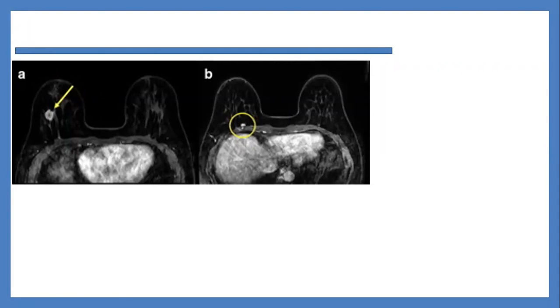mass lesion, or it could be a lymph node. It is small, oval, and enhancing. So it could be a metastatic lymph node from the cancer, or it can be another nodule, another mass, another cancer. I need to look at the other images to clarify.